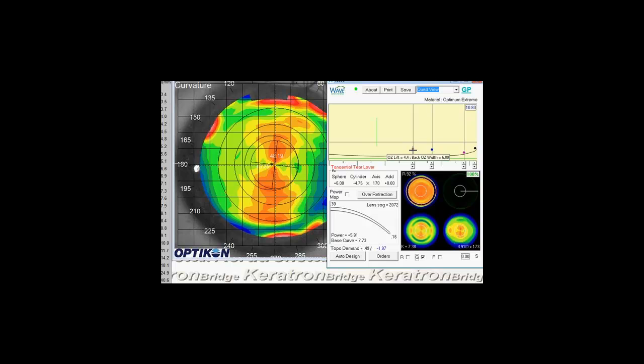And I'm going to combine step 3 and 4, because the IC placement, which is this blue dot over here, is really just another control point to think of in that far mid periphery of the contact lens. On a normal cornea, we really just keep it about 1 millimeter to 1.4 millimeters beyond the optic zone. It gives us a nice area to control the lens down the road if it's needed. Since this is a normal cornea, I'll put this right at a 7.4, and that should give us a nice back surface to the lens right there.